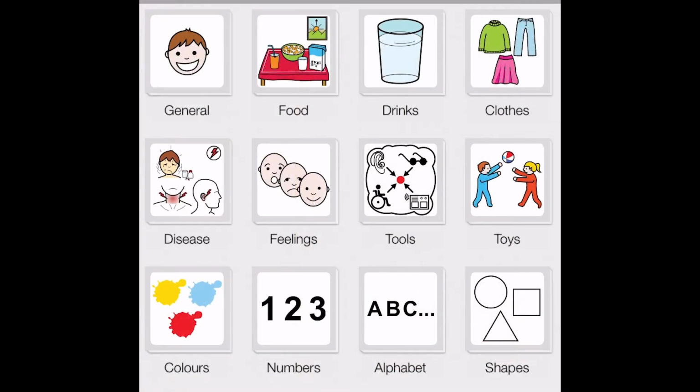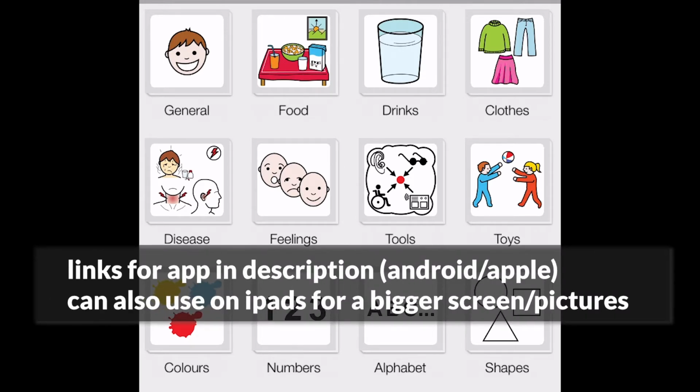Okay, so here we are in the first set of things that are downloaded when you download the LetMeTalk app. And I'm going to show you guys a bunch of things on why I'm absolutely obsessed with this for a physical therapist and also to help educate parents. First, it's totally free. So it's easy for you to download on your iPhone, your iPad, Android, all of the things and all of the places.